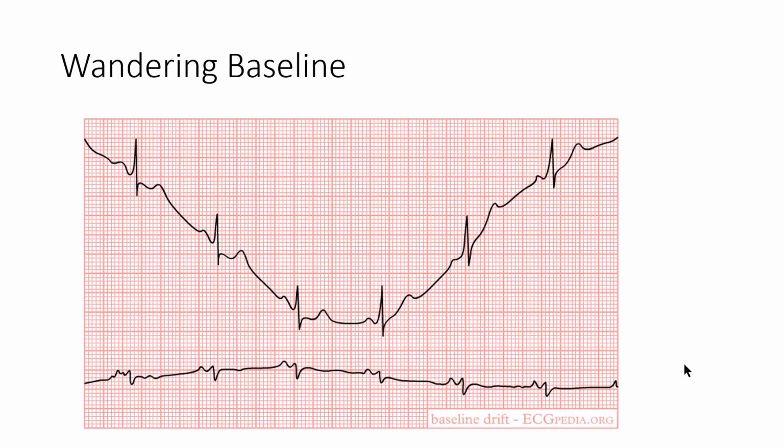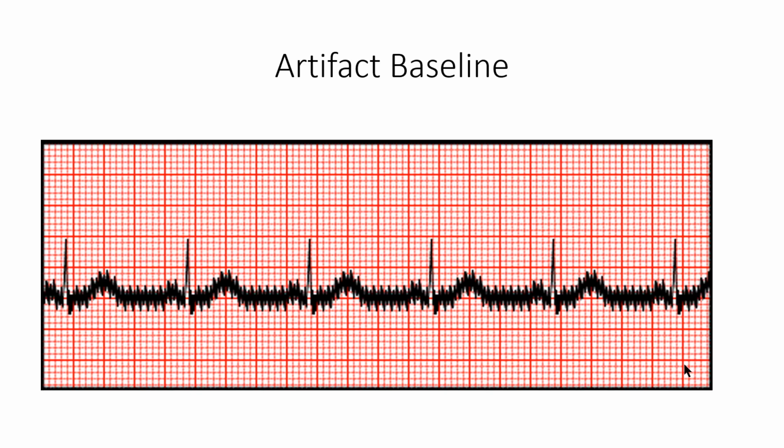If somebody hands you an EKG like this, you need to say, I'm sorry, this is not going to work. We need to repeat it. Also, we've got some artifact in the baseline here, which essentially makes the EKG uninterpretable like the previous one. This one needs to have the leads cleaned or get away from some source of electronics, but something needs to be done to give that baseline a haircut.